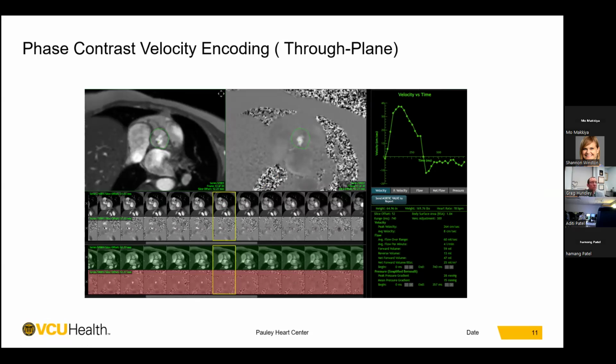What we need to do is find a good image and circle your region of interest. In this case, we're looking at the level of the aortic root, and then you can propagate this to all slices throughout the cardiac cycle. Make sure you include all the flow within the aorta, and exclude all other flows outside, like the RVOT or SVC. You should not have those in your sampling, as this may contaminate your results. And with that, we can get our summary.